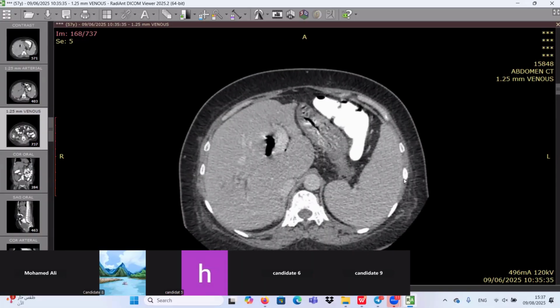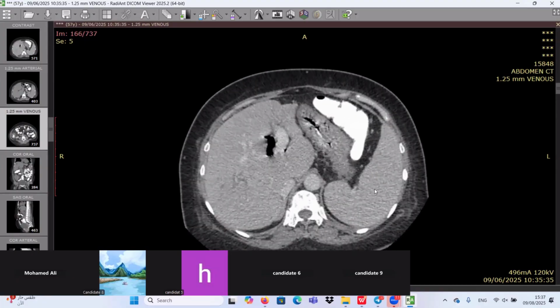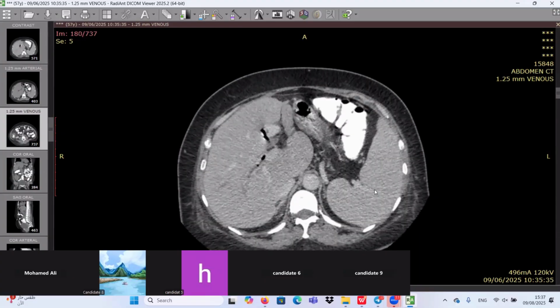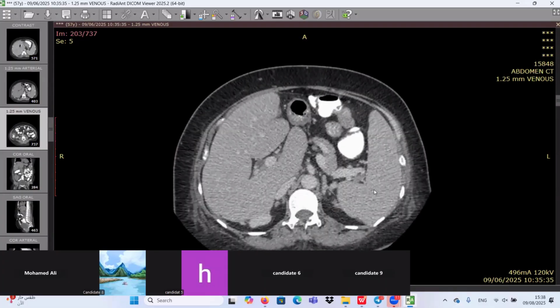Are these focal lesions peripherally enhancing? Which one? No, this is branching. Yes, this is branching. What is this one? You are right, this is just increased intrahepatic biliary dilatation.